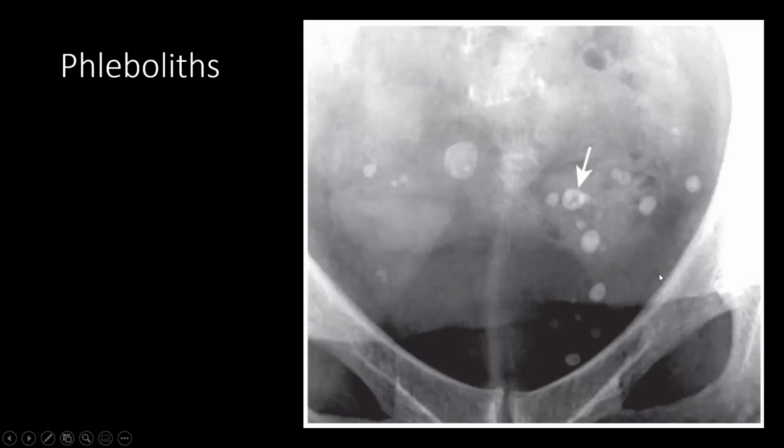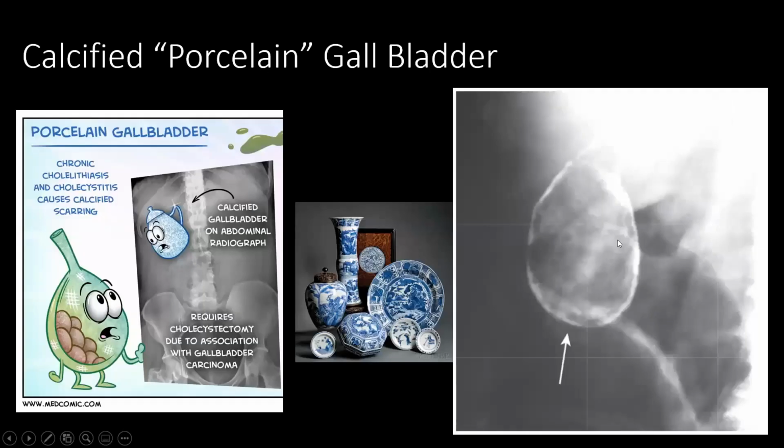So this is the first calcification that we might see, and it's in the pelvic veins in women, and most likely as you grow older. So in elder females, you will see it more likely than in younger females.